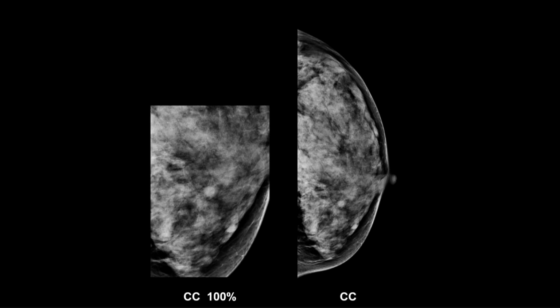Okay, so at full pixel resolution, this asymmetry has a somewhat indistinct margin, which might make you a little bit more concerned. You notice it in this very dense breast because it's so bright, it's so white. And cancers often look whiter than similar sized areas of fibroglandular breast tissue. So there's some reason to be concerned. On the other hand, it's a one-view finding. It's an asymmetry. We know from yesterday that more than 80% of these turn out to be summation artifact.